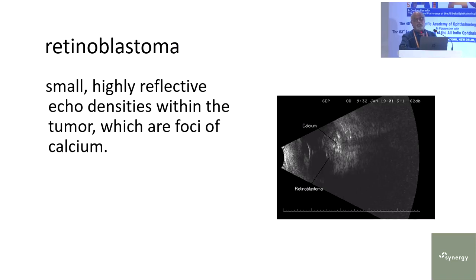It was diagnosed at a very late stage. He was punished by the DMC with 15 days of retraining in ophthalmology only for this reason, that he did not ask for an ultrasound in a patient with retinoblastoma. And here you will find that these calcium deposits will give you a tall peak, and this is a key diagnostic of a retinoblastoma case.